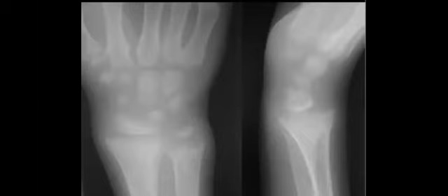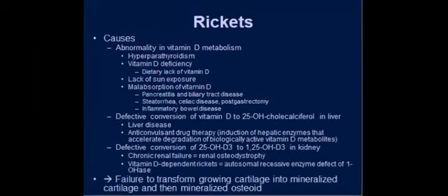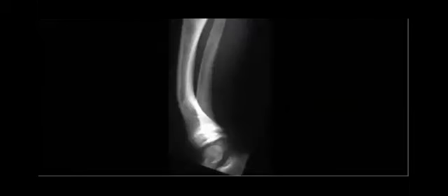And the questions here, they ask in the MCQ about the causes, especially the abnormality in vitamin D, and the other type, which is vitamin D resistant. Yeah. So they like many questions about rickets. Okay, I think everyone knows about it. I can just show you, sometimes it can come to you like this one.